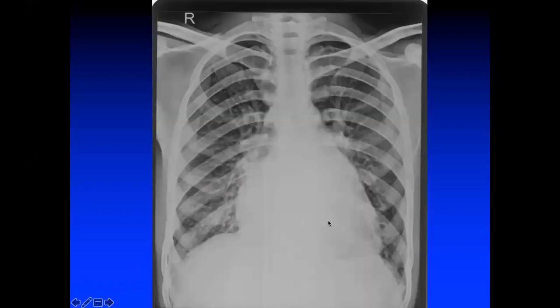Then this is again a very simple X-ray. You will have a double cardiac shadow. These are the two cardiac margins. There is straightening of the left heart border. There is a third mogul which is very prominent, so the left atrial appendage is very prominent. And then there is the left apex which is enlarged. And here you can see the angle. So this angle is obtuse.